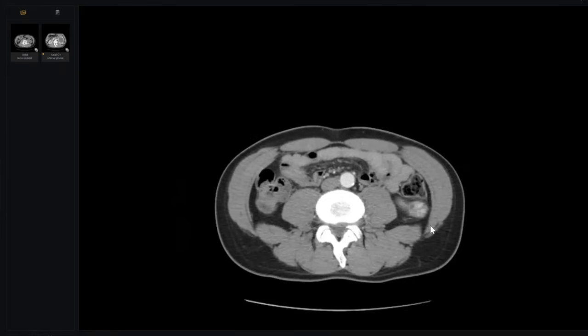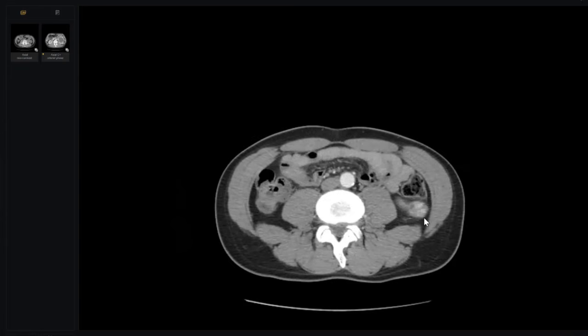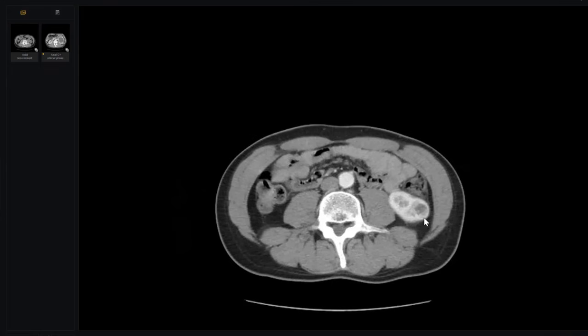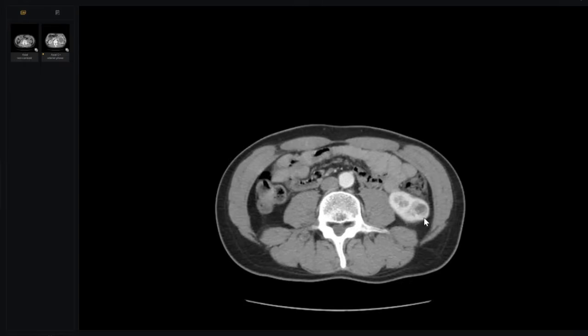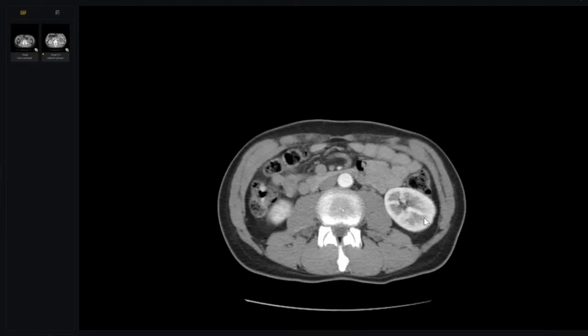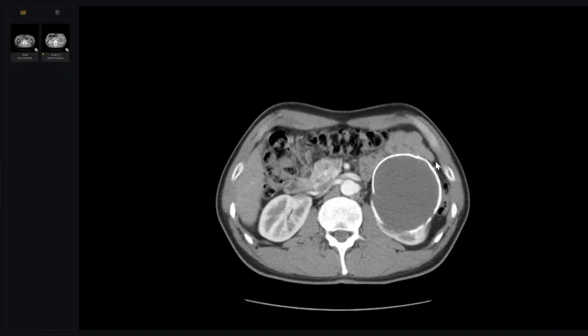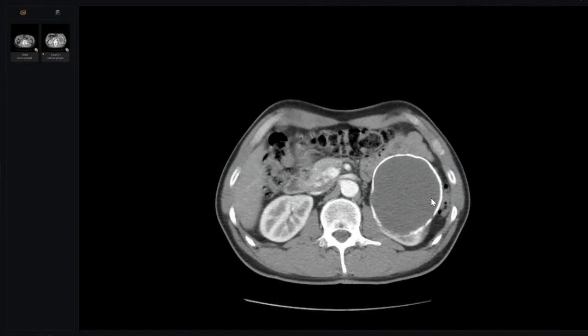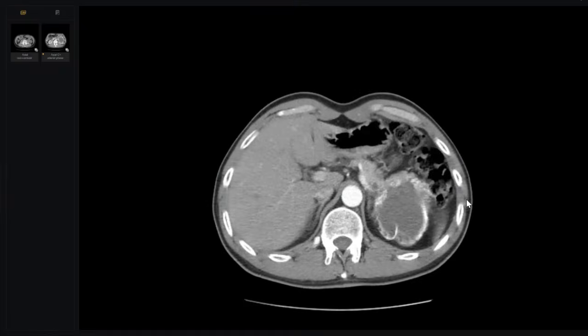If we go down here in the periphery, look here, irregular, non-uniform peripheral enhanced cyst. That is the key of this case. It is a little bit exotic. And by the way, some examiners will not give you sagittal or coronal, only axial. So our concern is not this one. This is a simple calcified cyst, nothing else.